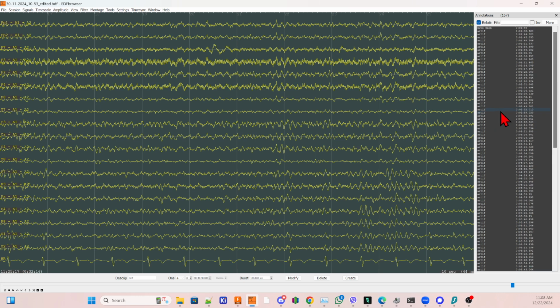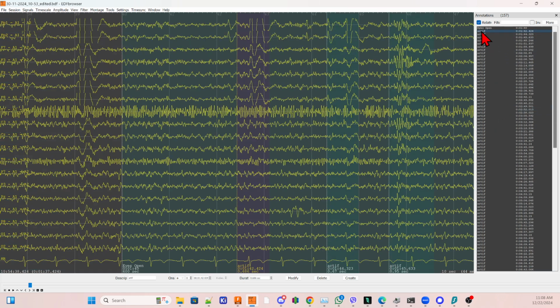Okay. Then we also want to annotate all of these short moments. First of all, when you look at this signal here, T7 doesn't look very good, and T8 also has that. T7 and T8 are often like that. I do not consider them in my analysis because they're almost always problematic, but also for meditation they don't add a lot of value.